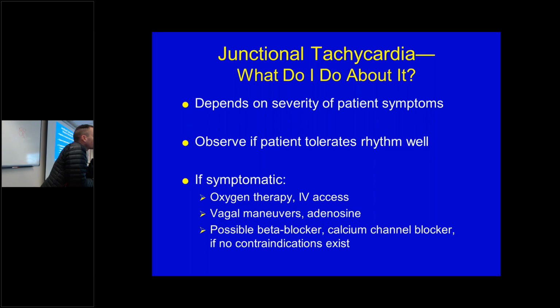With a re-entry pathway, it depends. A junctional rhythm will look very similar to an AVNRT, because it's nodal, right? Because it's through the AV node. If it's not nodal, the QRS is going to look a little bit different. If you have an accessory pathway that's not going through the conduction system, that's going to delay your QRS impulse, right? So you'd have a wider complex.